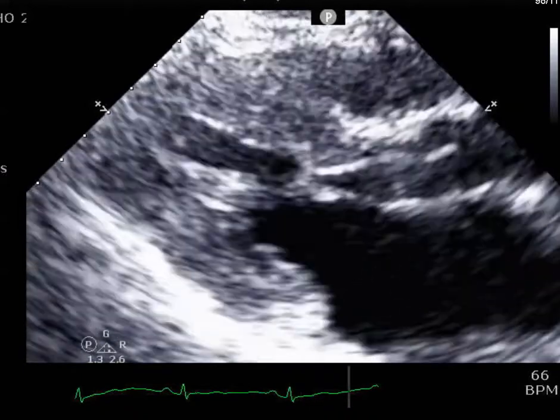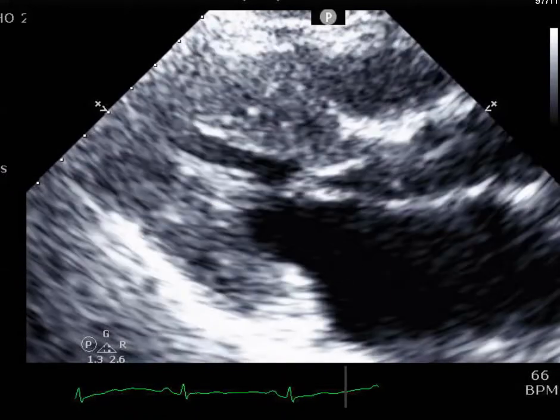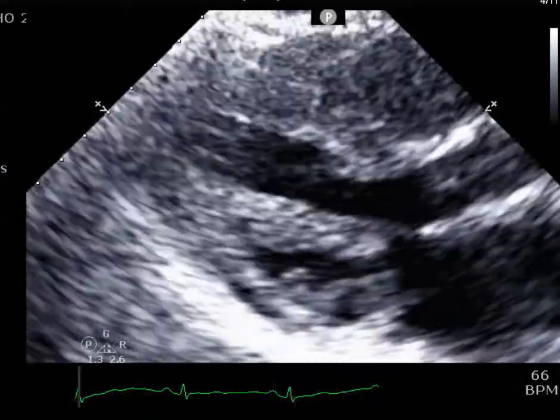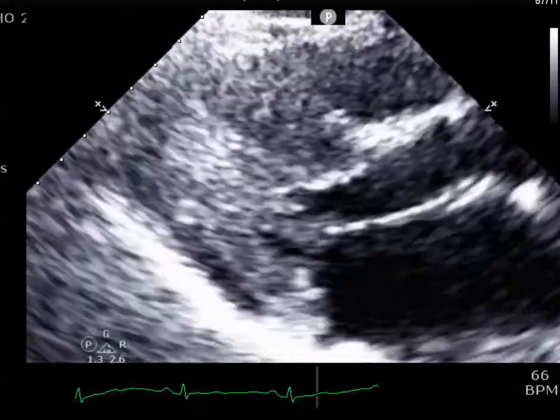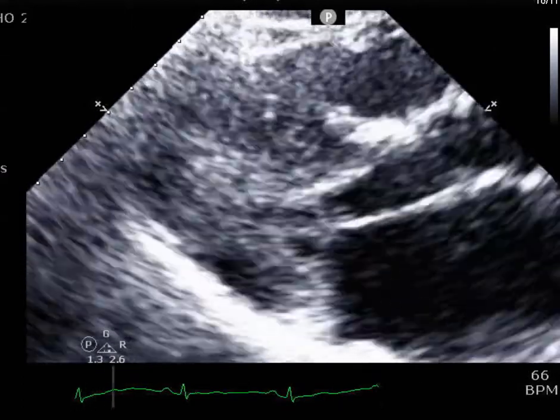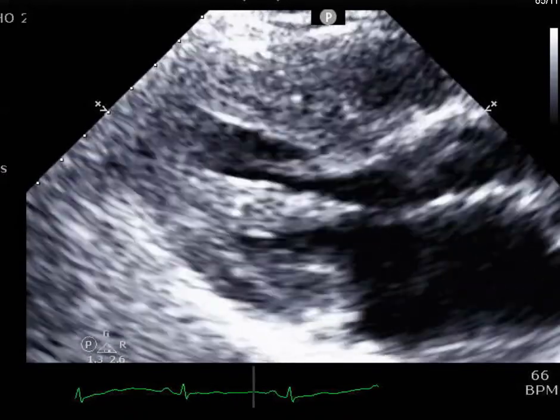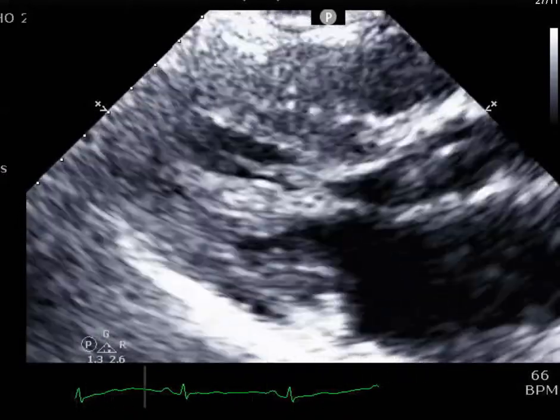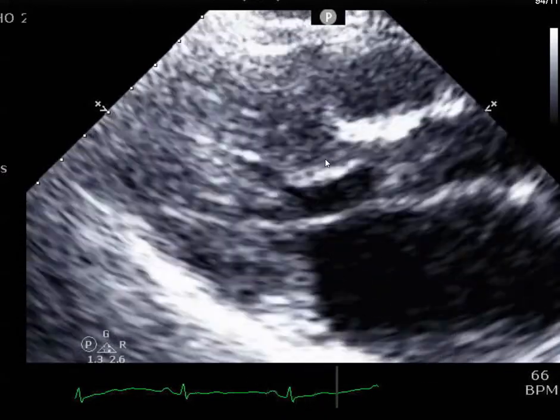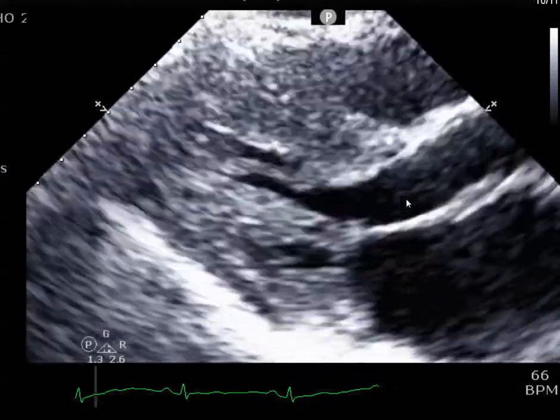You can have hypertrophic cardiomyopathy without obstructive disease at the LVOT. You can have hypertrophic cardiomyopathy with LVOT obstruction. You can also have severe aortic stenosis, or somebody that just had an AVR with now obstruction at the LVOT. You can also have a little old lady heart with a very small cavity and a septal bulge that's impeding the flow of the LVOT. So in this case, this patient actually does have an LVOT obstruction.